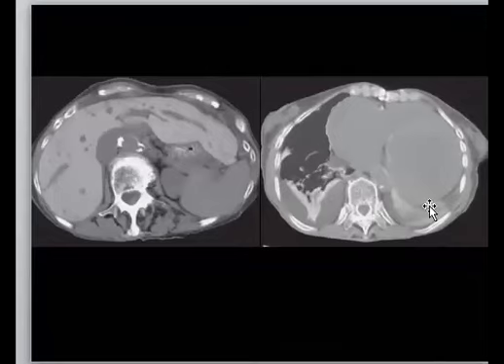This consolidation, what is the characteristic? It is hyperdense. So when you find hyperdense consolidation, and you also find the liver hyperdense compared to the other organs, you are talking about one of the treatments called amiodarone therapy.